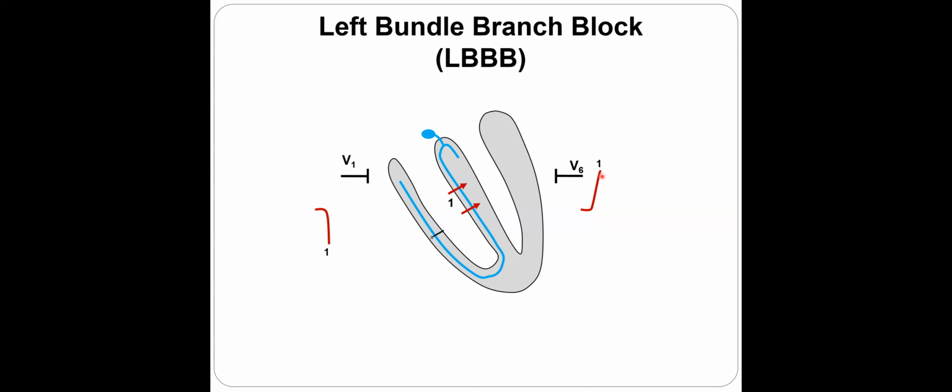And of course, later on, a little notch can be seen when the right ventricle is activated, but usually it's taking a part of the septal activation. Almost you cannot see it. But later on, from the right side to the left one, you do see a long and wide R wave. So you do see it's a W or QS complex in V1 and an R, notched R in V6.